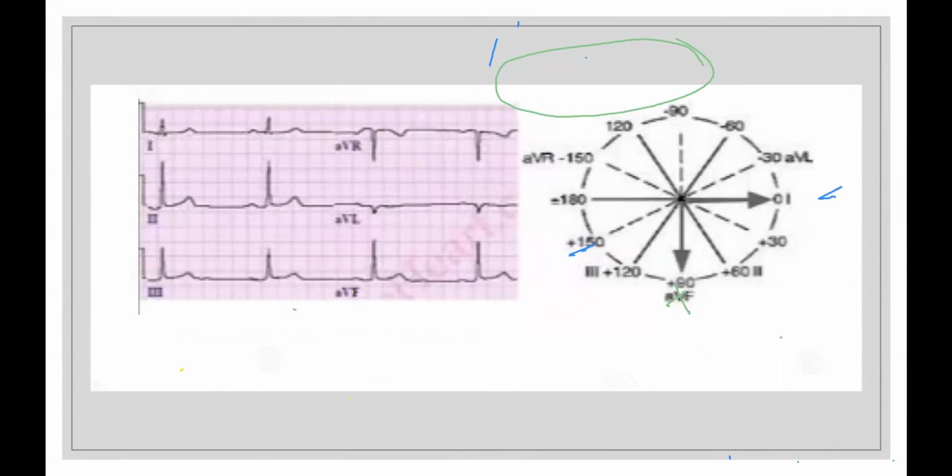So what about the other things? Rate, rhythm. If you see, the rhythm is okay. You cannot comment on the rhythm. Doctor, you do not have lead 2's current direction.